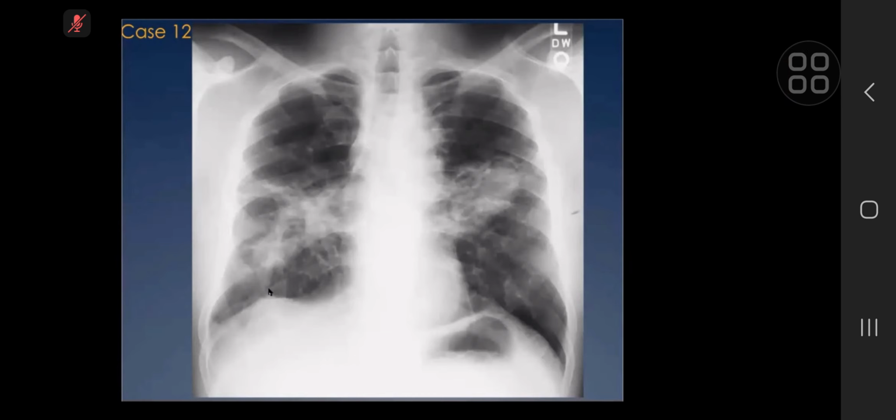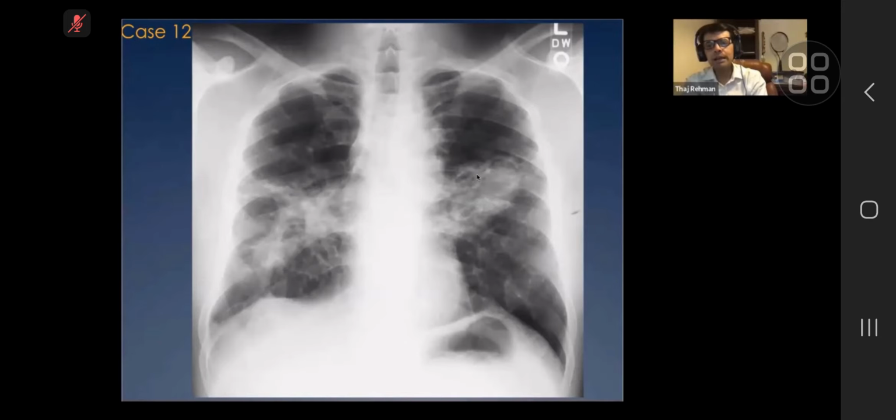The fungal ball can develop in previously formed cavities from tuberculosis, but tuberculosis cavities are typically in the upper lobes. The other differential would be vasculitis cavities, and then patients who are immunocompromised developing mycetomas in them. Right, this is sarcoid cavities with fungal balls. If you see cavities in the center, think about sarcoidosis. And there is so much chronic scarring going on.